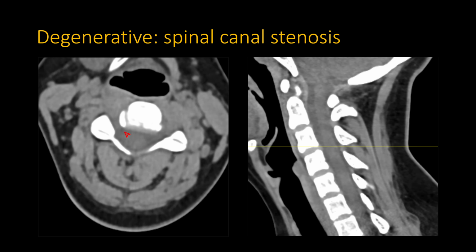If the CSF is beginning to get obliterated even laterally, or if the CSF is obliterated anteroposteriorly and there's a little bit of cord deformity, like the shape of the cord is affected, I typically tend to call that moderate. And I typically reserve severe stenosis for when the CSF is completely obliterated, or if I can't see the CSF very well, which happens a lot in just a CT. Just sort of go by gestalt: do I feel like all the CSF at this level is obliterated or not?